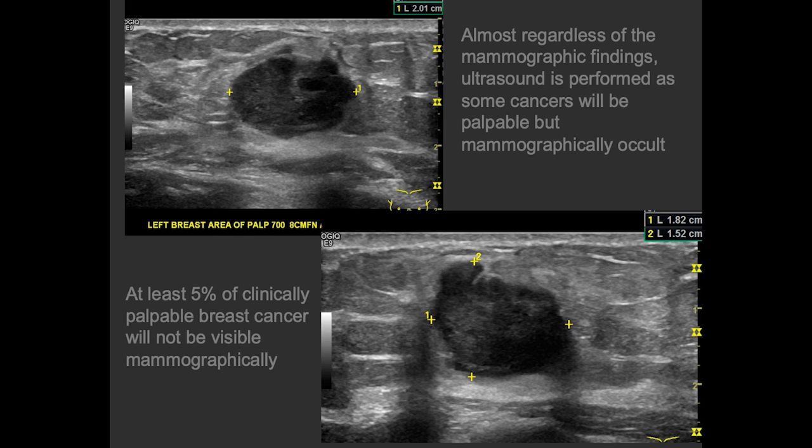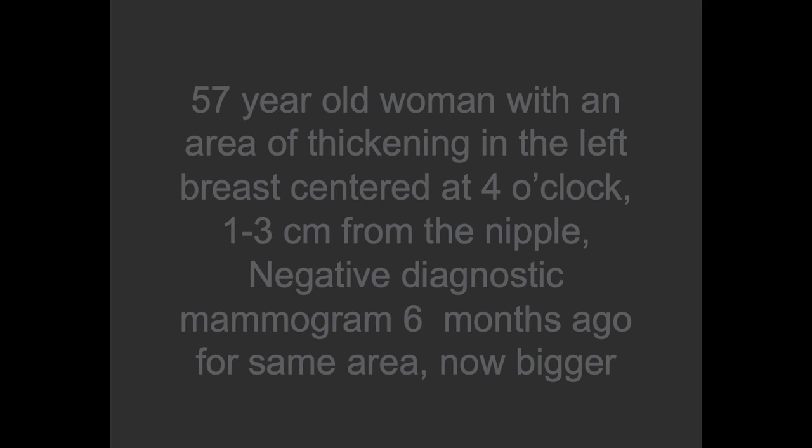In fact, this patient wasn't terribly dense in the area of concern. It was just the far posterior location of the mass. And at least 5% of clinically palpable breast cancers will not be visible mammographically. Another reason to always move on to ultrasound.